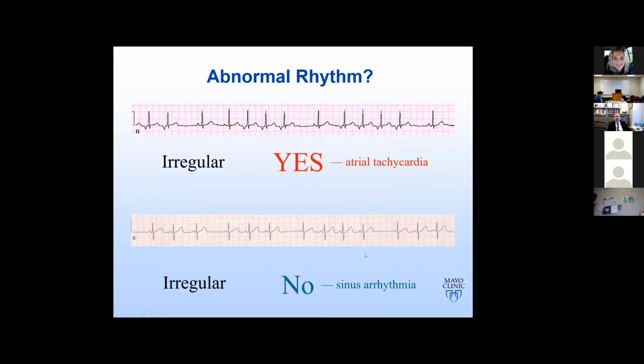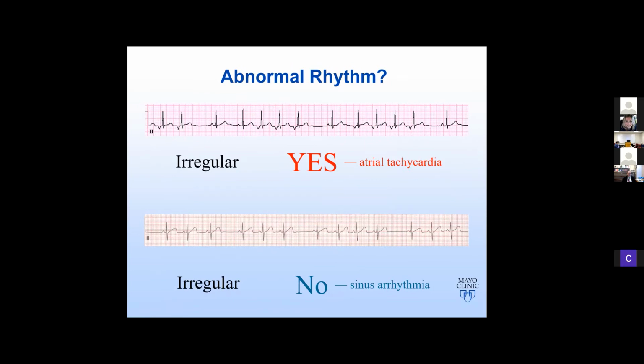So this is what we call a sinus arrhythmia. And a sinus arrhythmia, when you breathe in, the heart rate speeds up. When you breathe out, it slows down. This is much more commonly seen in small patients. So if you predominantly take care of adults, you will not hear this very much. But realize that the heart rate can double when you breathe in and be cut in half when you breathe out. So you can hear a very marked change.